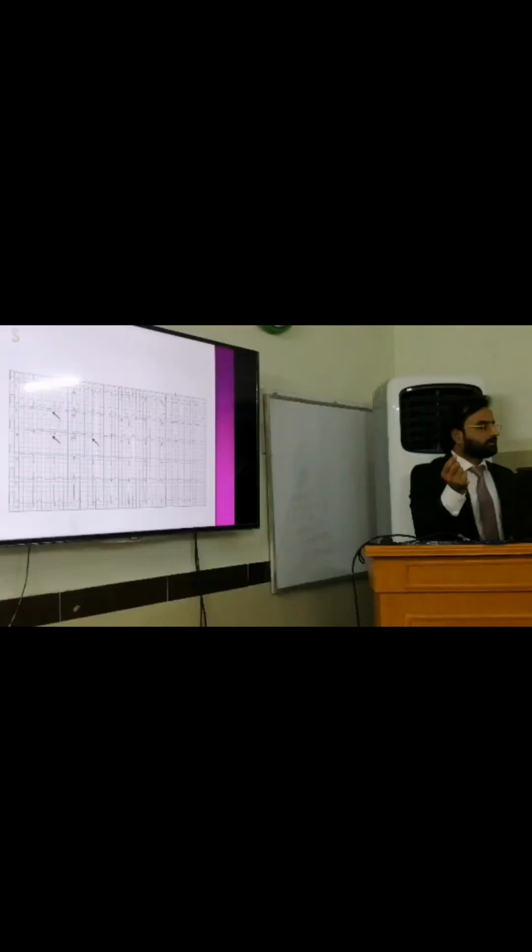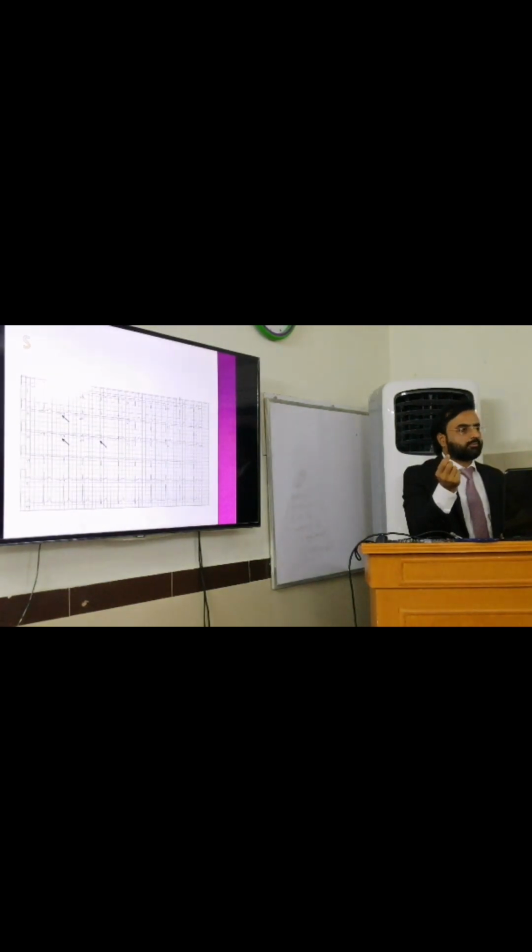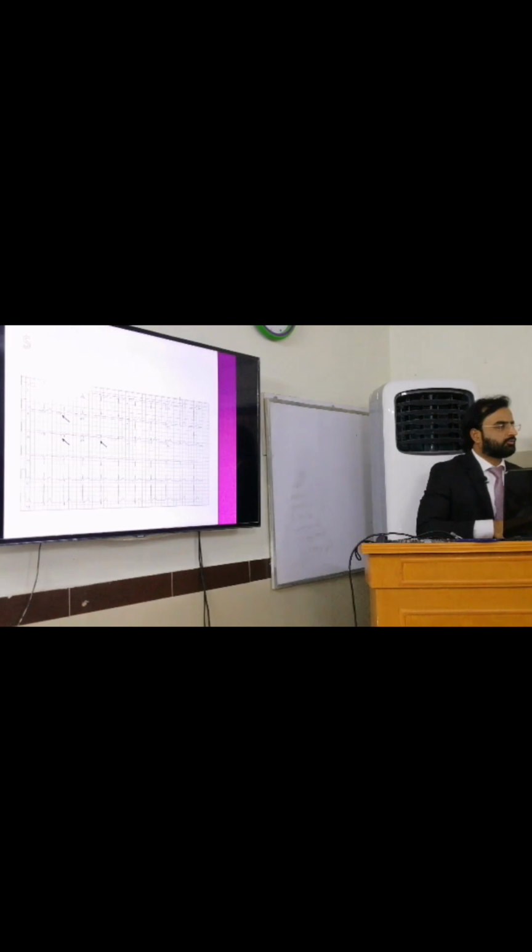Broadly we categorize the QRS complex as either a narrow QRS complex or a wide QRS complex. A narrow QRS complex by definition is less than 0.12 seconds, or less than 3 small squares. That is the normal morphology of the QRS complex. But in certain states, as we see in tachyarrhythmias like ventricular tachycardia, bundle branch block, certain electrolyte imbalances, hyperkalemia, idioventricular rhythm, many conditions can cause a wide QRS complex, that is more than 3 small squares or more than 0.12 seconds.